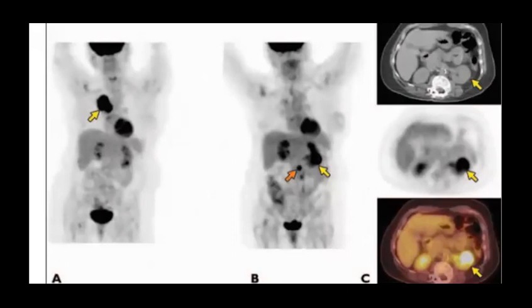So what happened here? What do you have? Hilar uptake. Nice. And you can say maybe hilar, maybe right upper lobe. You can see the CT image and check it. Where is it exactly?